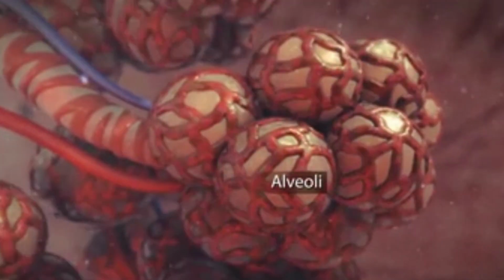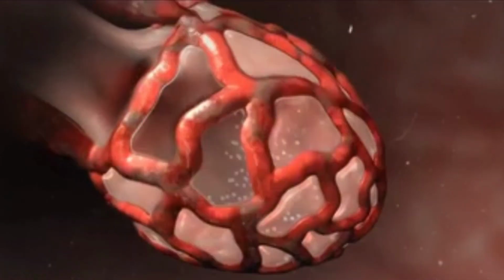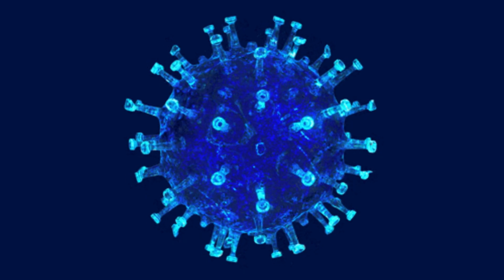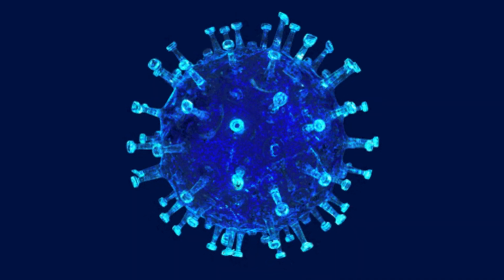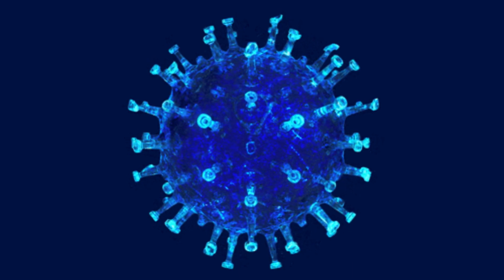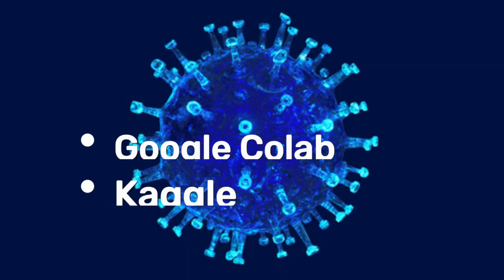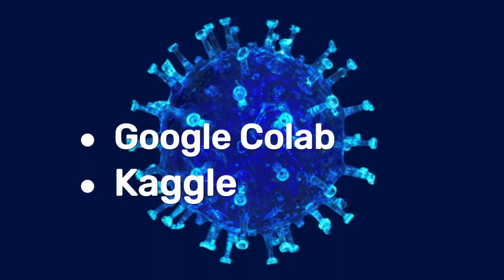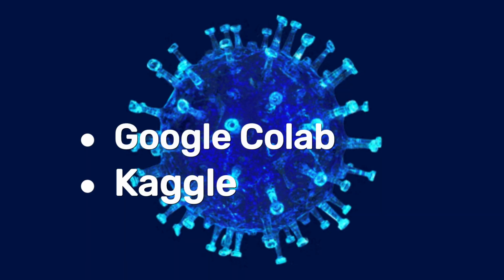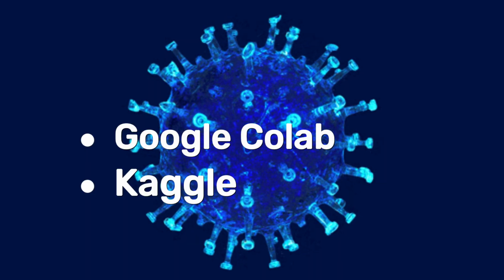In this project, I will take you through this whole process of creating this model for pneumonia detection using this language and of course using a library, and let's get on with it. So we will be actually implementing this in Python using two online platforms. You can definitely do it on your local machine, but today I'll be using two online platforms. If you're not already familiar with these two platforms, don't worry about it. I'll be teaching you how to use them in a quick and easy way.